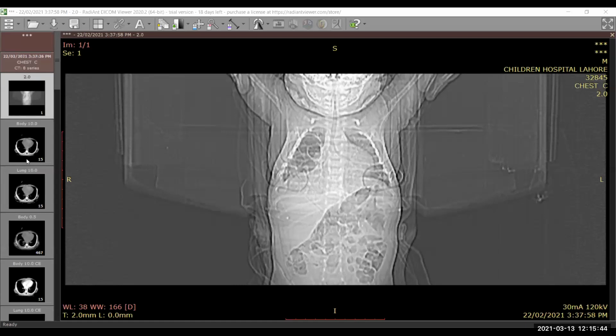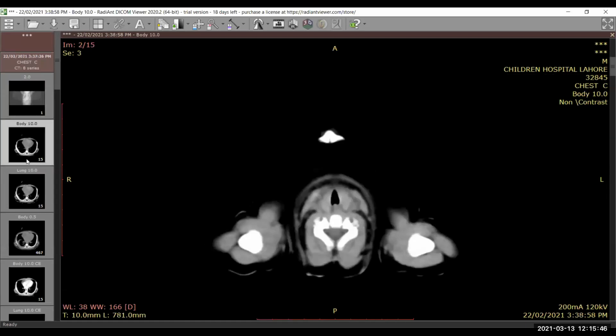Okay, good. I'll scroll through for you.